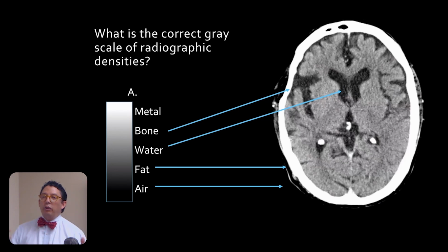How do we see these densities in CT? Do we see it sometimes, always, or some of them in each image? In most of the human body, you get to see all of them at the same time. And this is a true example. You can see that clearly the bone is whiter, so that's the bone.